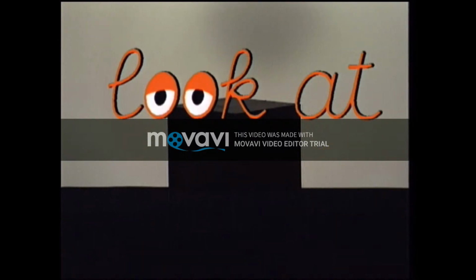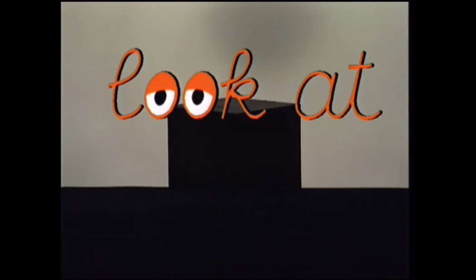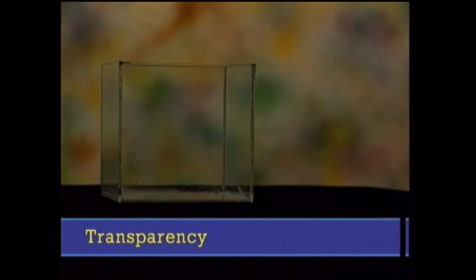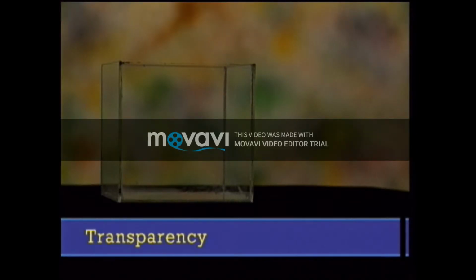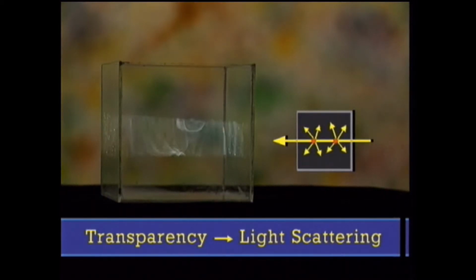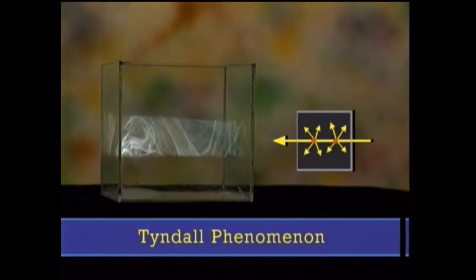An optimal examination strategy means do not just look at what you see. Skilled examiners look for what they want to see. For example, for the detection of minimal turbidity, that is, a minimal imperfection of transparency, light scattering is generated. This is demonstrated here in a cube filled with smoke, which is invisible unless a bright light beam renders its even minimal turbidity visible through the so-called Tyndall phenomenon.